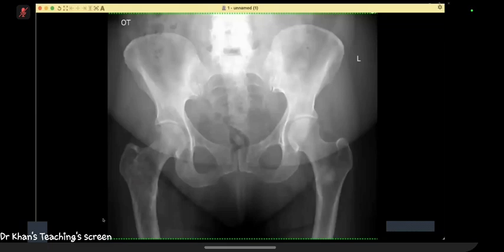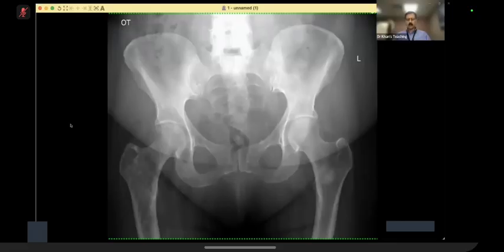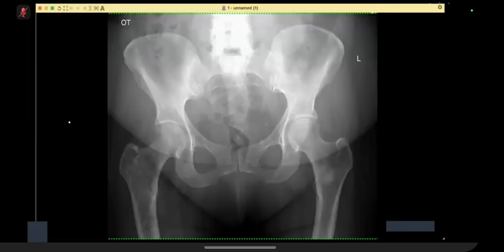I'm presenting a case of an X-ray radiograph of the hip joint. I can see an osteolytic lesion in the shaft of the right humerus. With the right femur, you meant? Right humerus? Right femur, I'm sorry. Right femur is showing an osteolytic lesion.